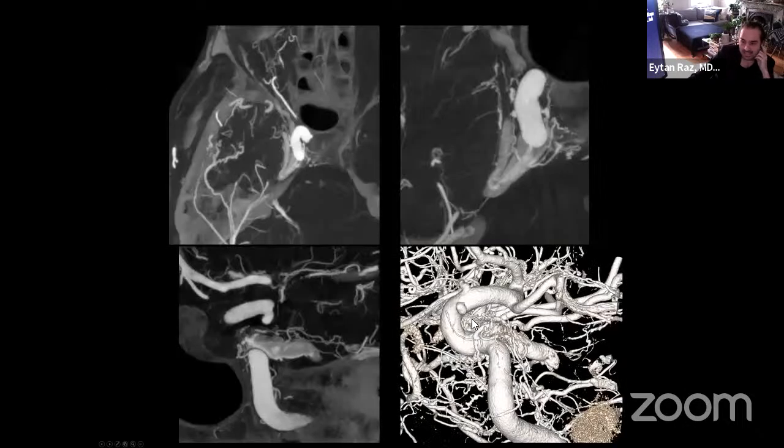then we get the DynaCT. And this is where the magic happens, because you get the DynaCT, now you look at the images in detail, right? And then the idea comes to mind, okay? Where to go to this fistula? You see the fistula here, the outflow, it comes like this, and then goes to the lateral cavernous sinus, to the deep sylvian vein territory, right?